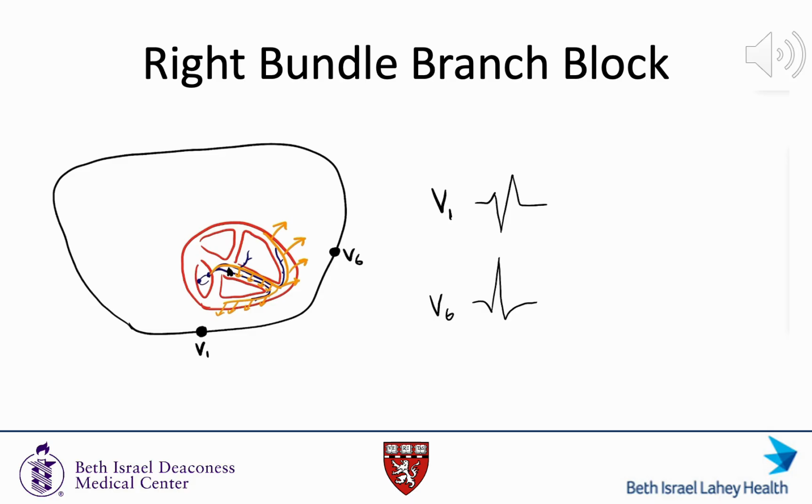And so here in V1 is an RV lead. So that's why it's sitting right over the right ventricle. Even though there aren't a lot of myocytes in the right ventricle, you can pick it up electrically. It's not dominated by the LV here in V1. And so that gives you the R prime, and that's why the R prime is wider. Typically, you have your R, and then your R prime is wider because that's myocyte to myocyte communication. That's not down the native conduction system.